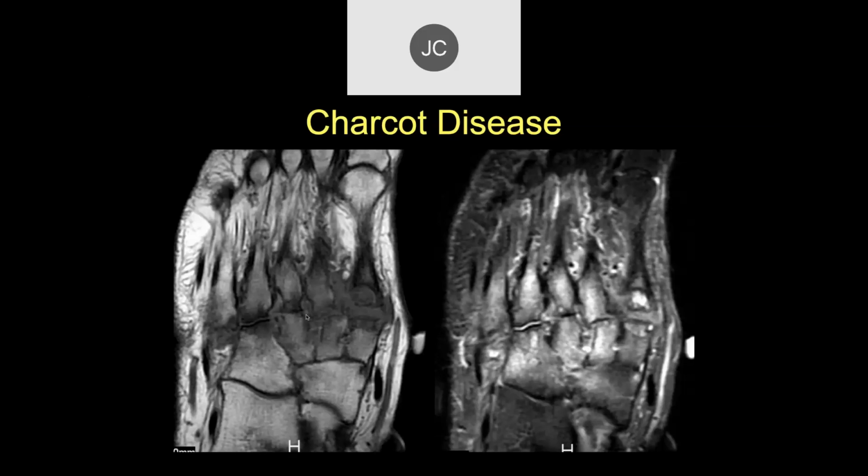And you probably see more swelling in infection, and a sick patient. Absolutely. Yeah, and you'd see generally a lot more diffuse soft tissue edema, whereas with Charcot disease, the soft tissue edema is relatively sharply delineated, and you don't see this really massive edema involving all of the soft tissues.